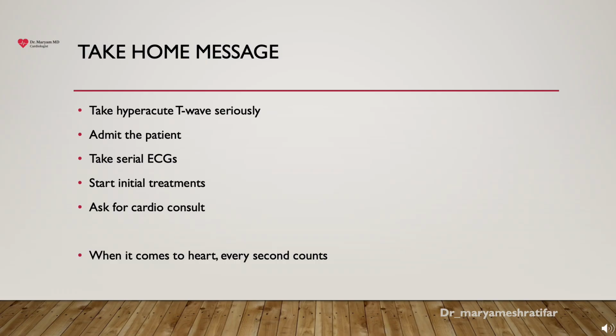As a take-home message, I want to summarize: please take hyperacute T waves seriously, even if your patient does not have significant symptoms. Hospitalize the patient, obtain serial ECGs, and start initial treatments. And also ask for a cardio consult. As you know, when it comes to the heart, every second counts.